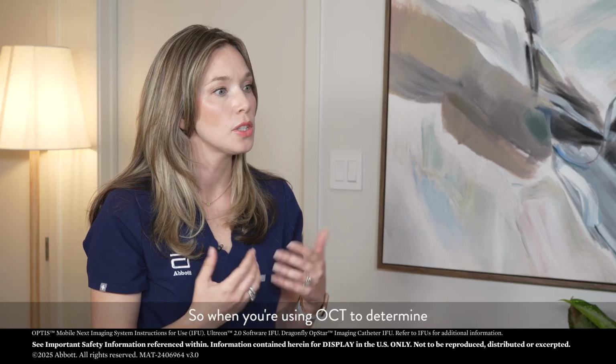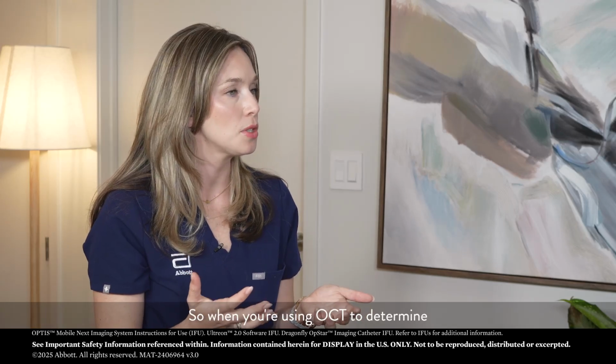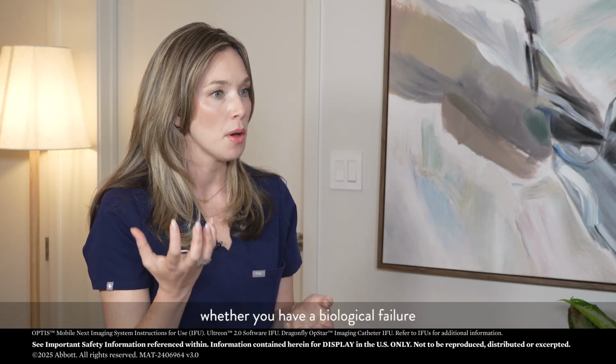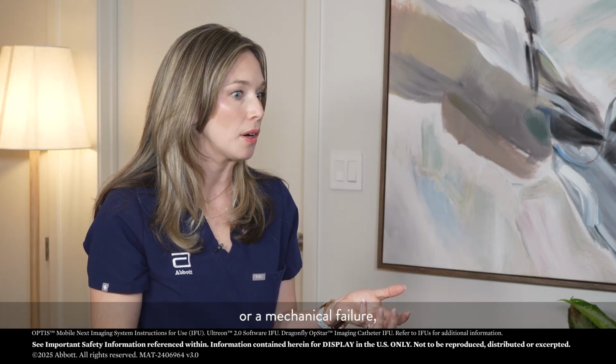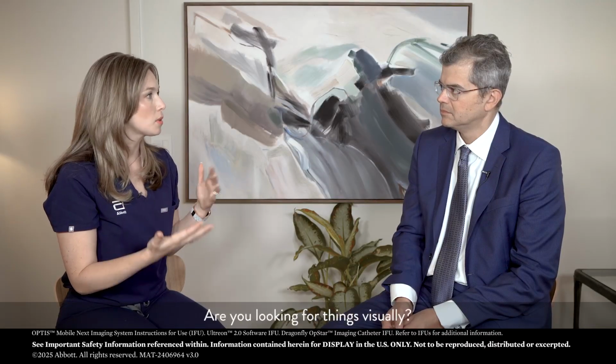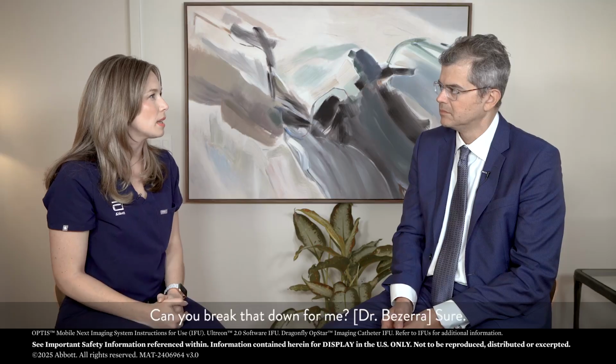So when you're using OCT to determine whether you have a biological failure or a mechanical failure, how do you assess that OCT image? Do you do measurements? Are you looking for things visually? Can you break that down for me?